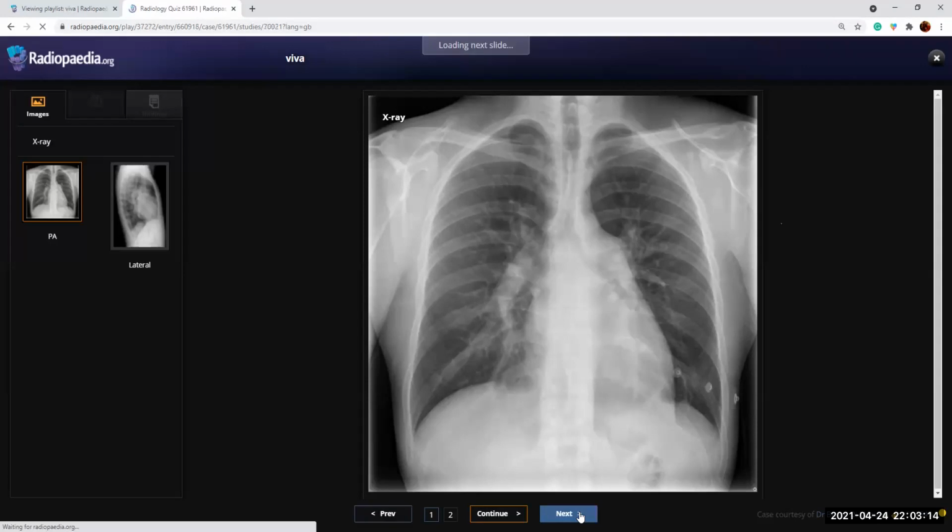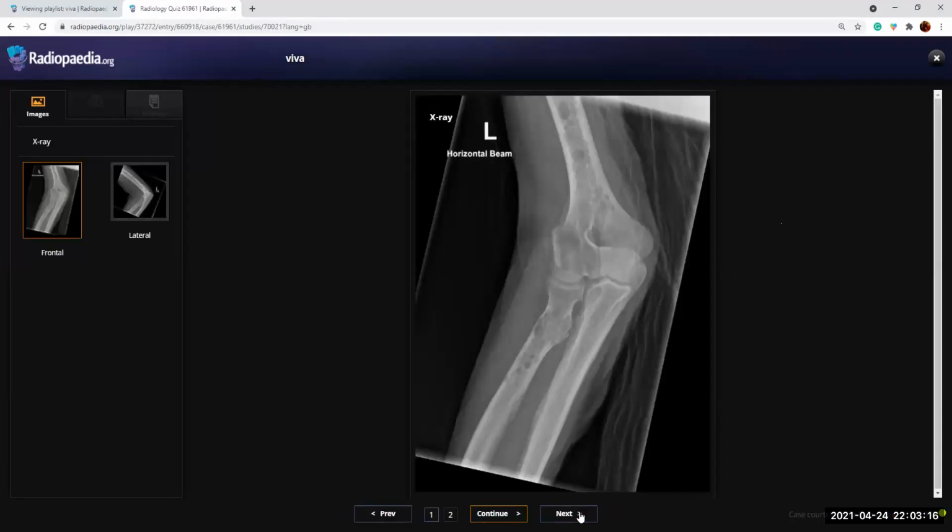That's okay. We'll jump on to the next. You were going all right till you mentioned metastatic lesions and multiple myeloma was fine. The moment you said osteomyelitis, you have gone off board, because if it was in one single bone, you can still think of it. But it's across the joint space. Unless the joint is involved, osteomyelitis is not going to come across to the other bone. So that should not have been in your differentials. Otherwise, it was fine, as long as you had metastasis and multiple myeloma.